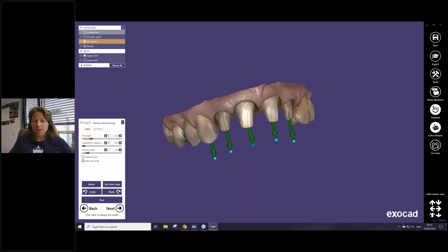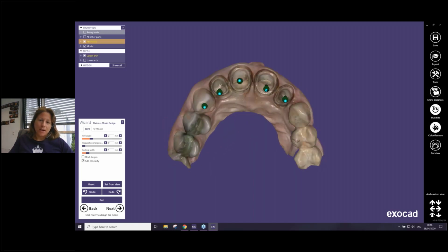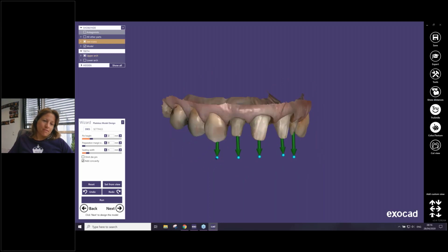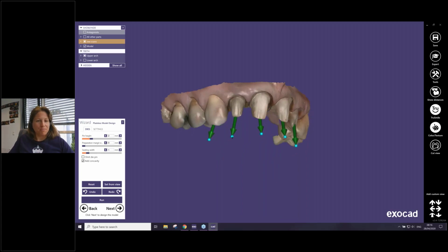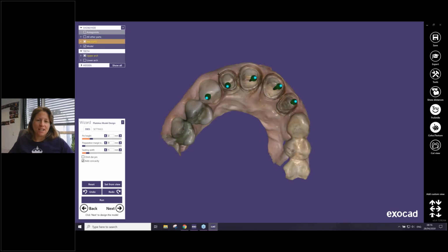Important: if you select separate insertion directions for each die, don't choose an insertion direction that is too tilted. It's not a problem, the software will correct it, but then later the dies will be cut a little bit.